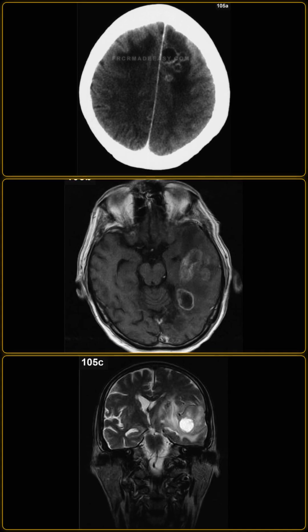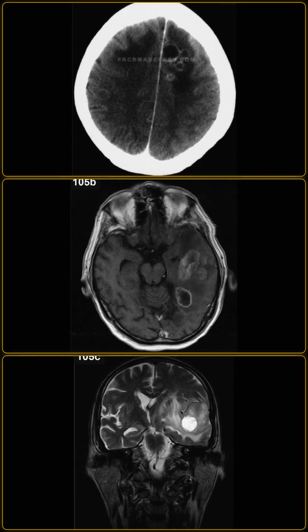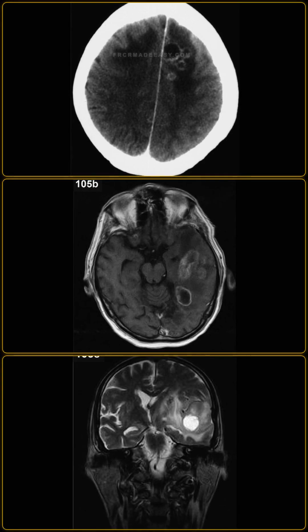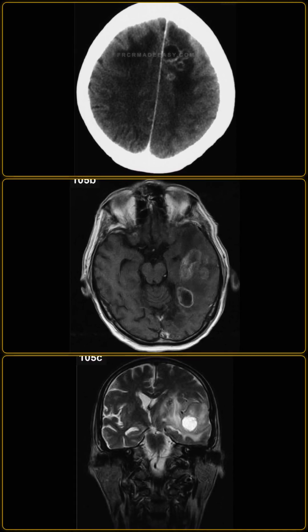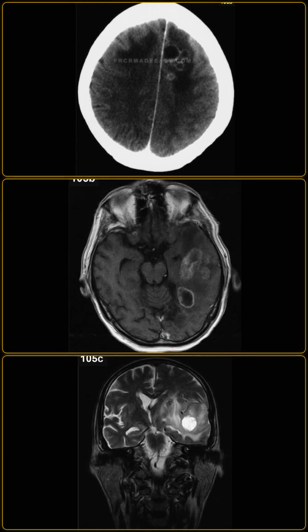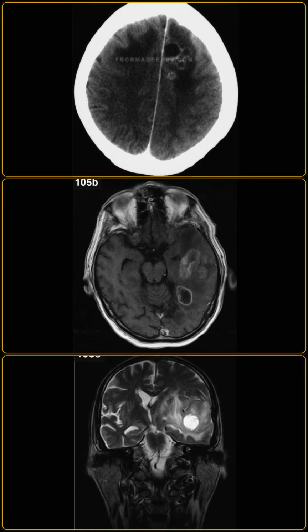I am showing you Axial T1 post-contrast and coronal T2 weighted MRI scans of the brain. What do they demonstrate? In that case, the Axial T1 weighted post-contrast MRI confirms thin, uniform, smooth rim enhancement of the left temporal lobe lesions. The corresponding coronal T2 weighted MRI shows a central hyperintense abscess cavity with extensive hyperintense surrounding vasogenic oedema. This oedema is causing moderate mass effect and mass displacement of adjacent parenchymal structures.